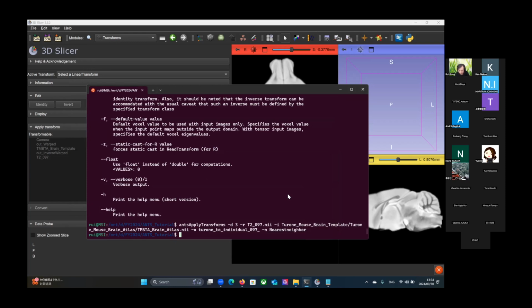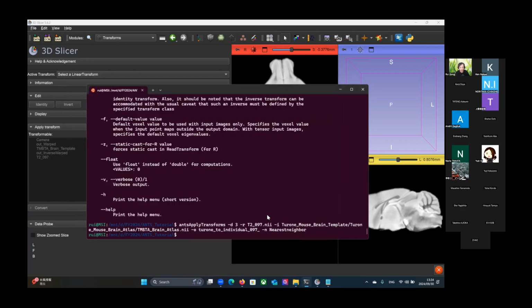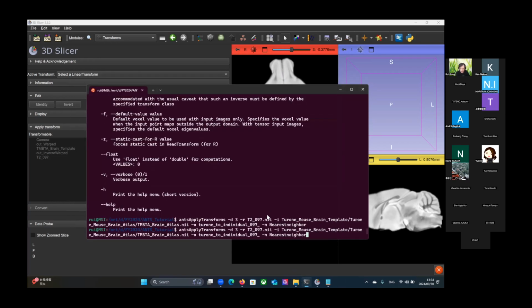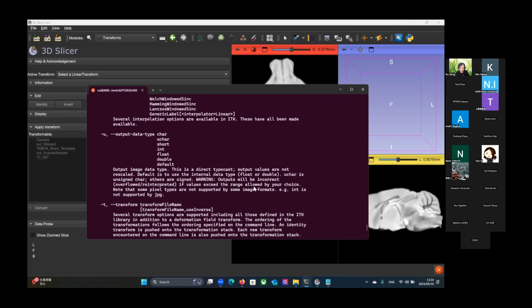I don't know why. Maybe this is too long, or I spelled it wrong.